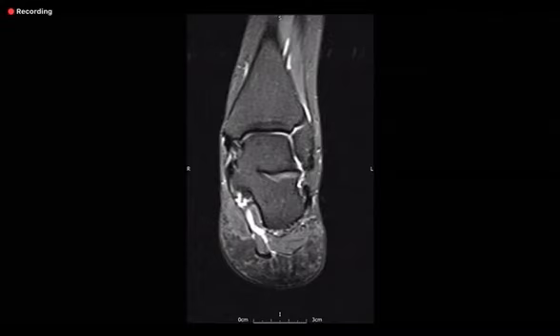Because the patient is symptomatic from this deformity, orthopedic referral would be helpful to assess. And also, I'm thinking down the line of whether there is any surgical correction that the patient can have. But clearly on the MR, I can see signs of tendinitis secondary to this. So the answer is totally different.